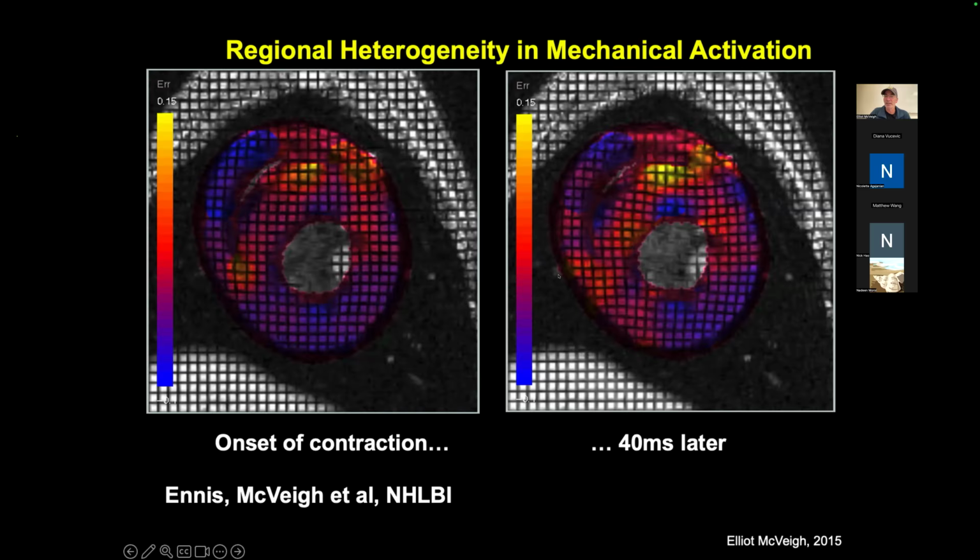CT can get very close to this where you have physical boundaries and features that you can track, such as the endocardium, and we saw that in the CT applications, right? We had all of the trabecular tissue like crushing down, and you could track all that stuff. But that's just on the endocardium. CT can't help you out in the middle here because everything is that same myocardial gray, right? It's like 60 Hounsfield units, and there's nothing to track, right?